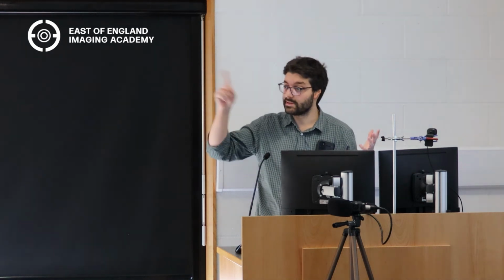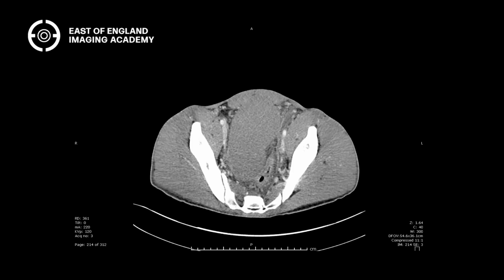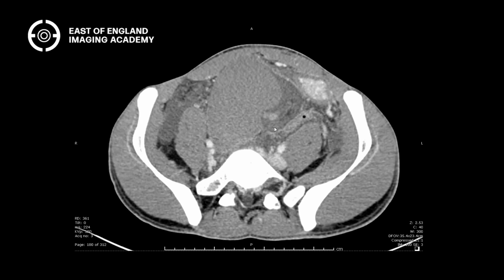And so anything that's floating on the vascular pedicle, what can it do? Tort and twist. What other organ lives on the vascular pedicle of the spleen? Not the stomach. It's the other organ that we didn't see, pancreas, because the pancreas is stuck right onto the splenic vein. Yeah, it's actually a good anatomical marker for finding the pancreas, is looking at the splenic vein.